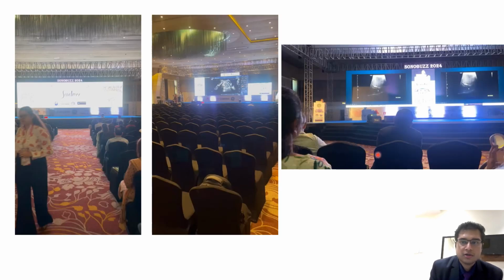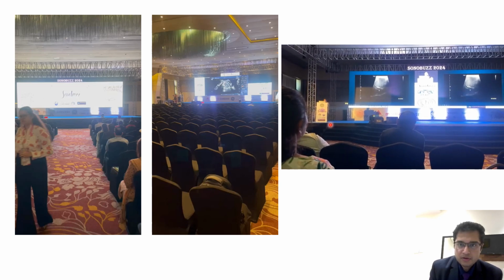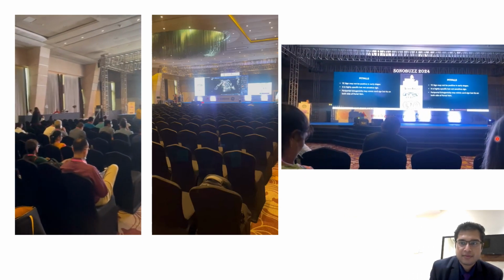So this is the conference hall. Thrombosis could be due to lymph edema or any other. That we can see this. Or maybe the entire liver is hypoechoic, that is why you are getting this, but that is always on both the sides of the portal.